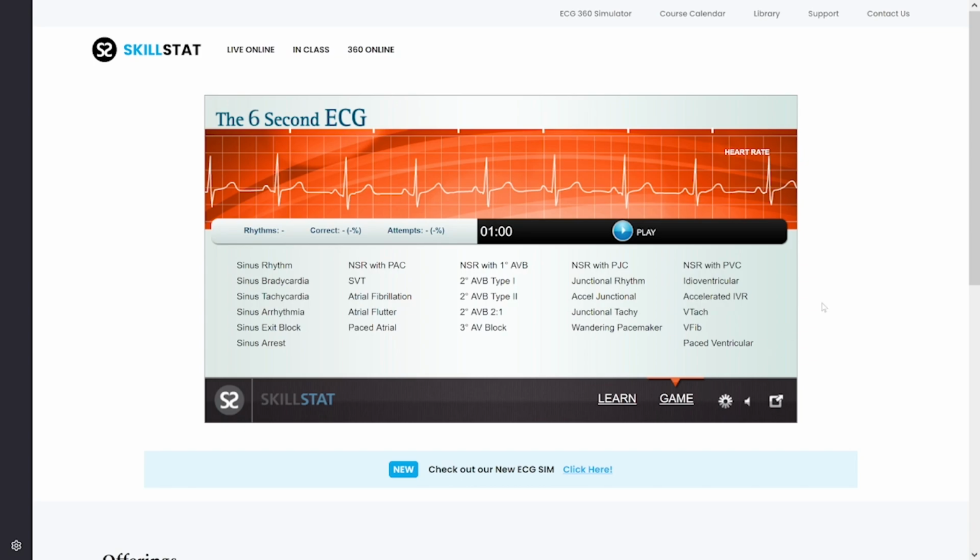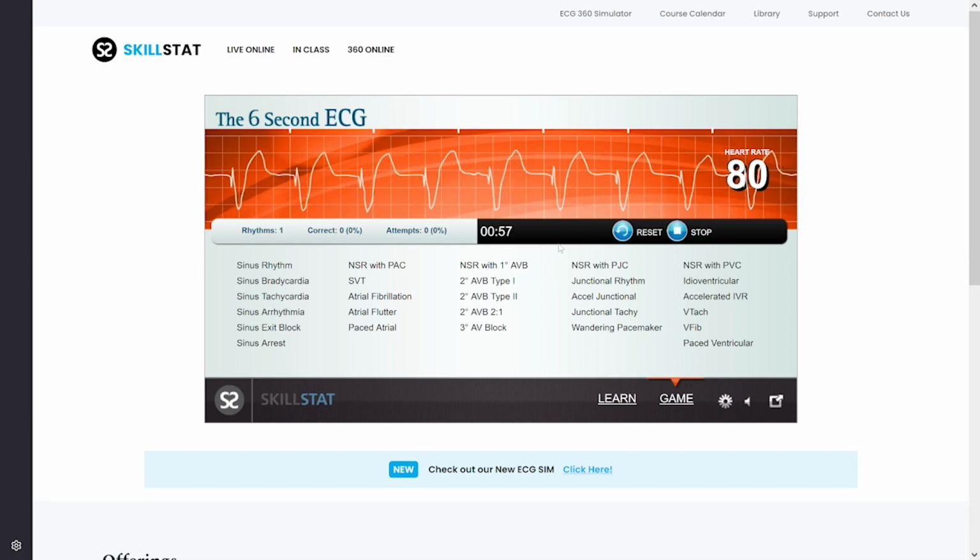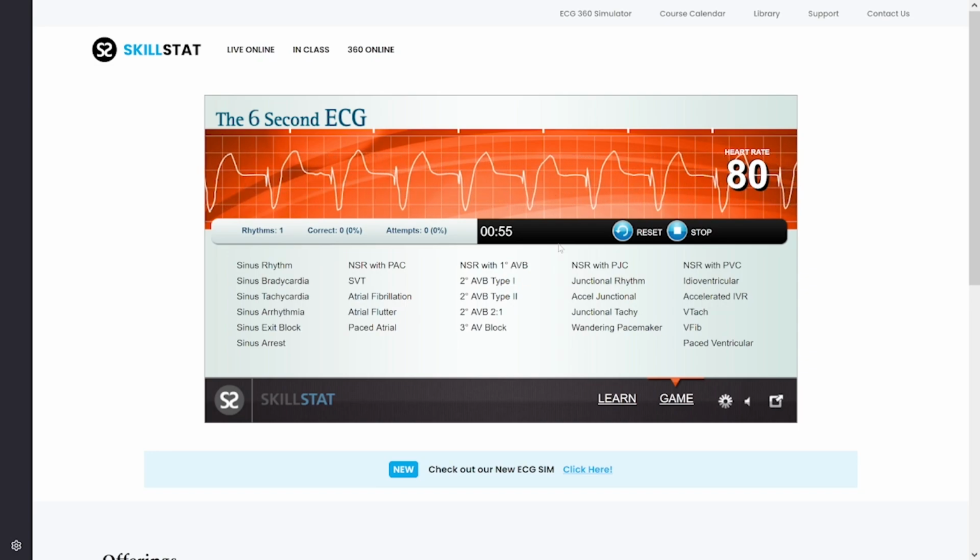They changed it up from novice to practitioner. But I'm going to start. I'm going to let you guys think about what the answer is. I'm not really going for the highest score I can get, but I want to see what you think is the answer. I'll give you about my actual real time 30 seconds, and then I'll pick an answer. So we'll just keep going that way. So here's a rhythm. What do you think it is? I'll give you a moment to think about it.